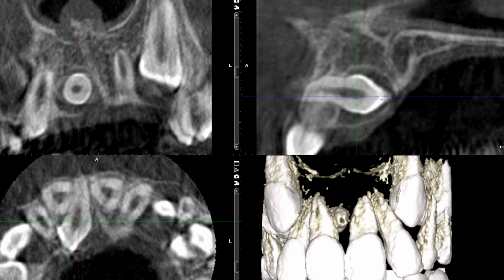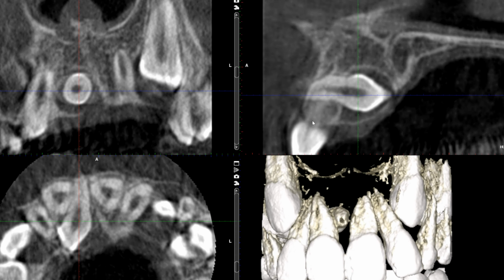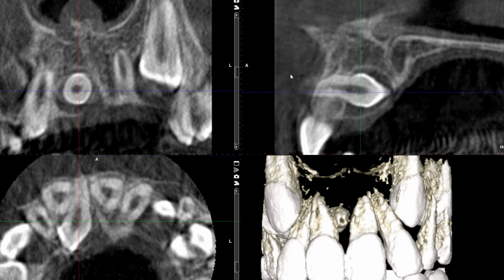Again, keep in mind, when you take a periapical radiograph, the beam doesn't come horizontally, but rather the beam comes at an angle, 90-degree angles, to the sensor and the long axis of this incisor. So when you have the angulated appearance, this horizontally positioned item, or the tooth, will appear somewhat inverted, because again, visualize that the beam is coming in this direction, and the beam that captures the crown information is captured in the upper half of the sensor.